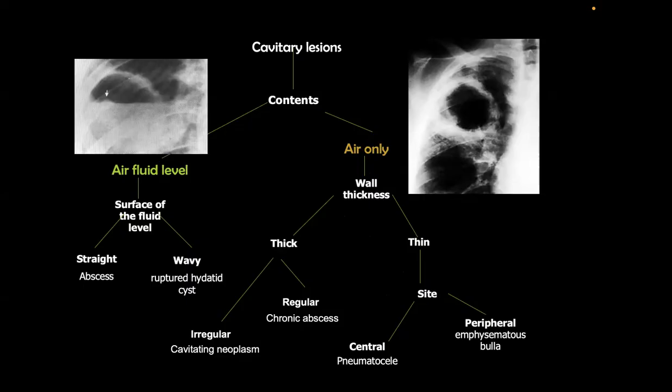The hydatid has the same characteristics, but the hydatid is an opacity. It's because a hydatid cyst is a cyst and it's containing fluid inside. As I said, the image can tell you, but the most important thing, the clinical history also tells us the solution.